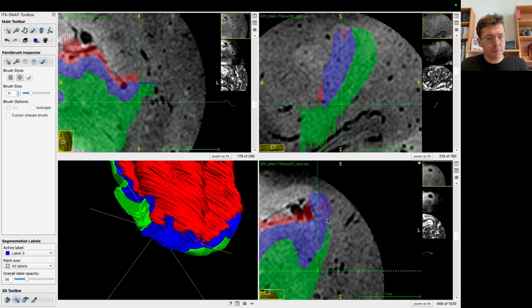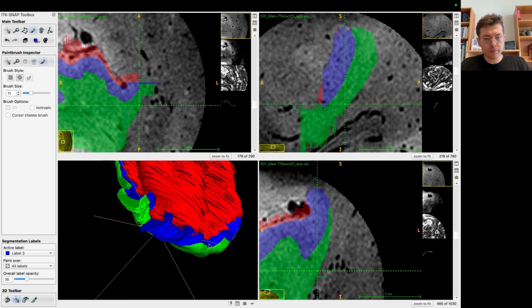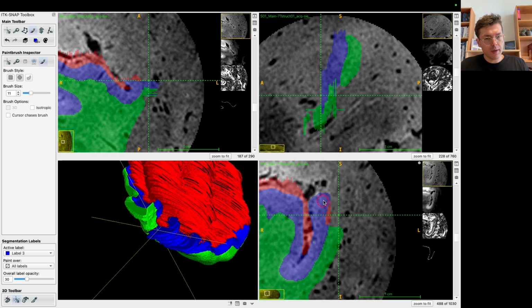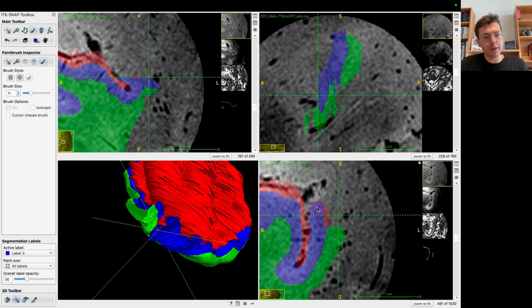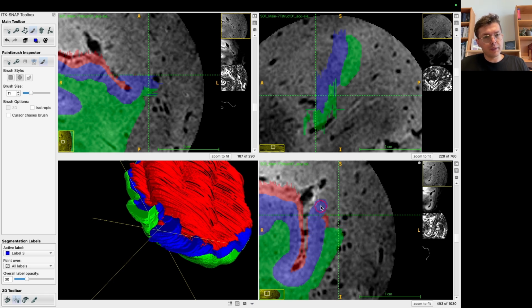Deep, deep, deep, deep. I was guessing that this area would be a problem. That's why I was extending earlier in the video. After some hemispheres, you do this, you will get a good feeling of how much you need to segment. I was segmenting way larger than this at the beginning. But then I noticed that I can just optimize for this 15mm in radius disc.